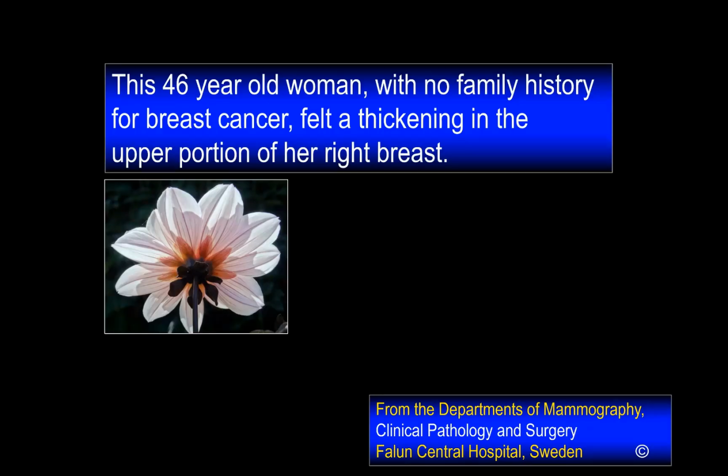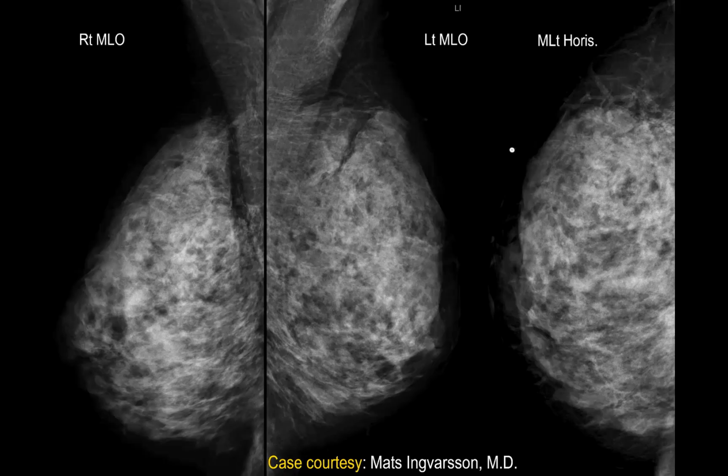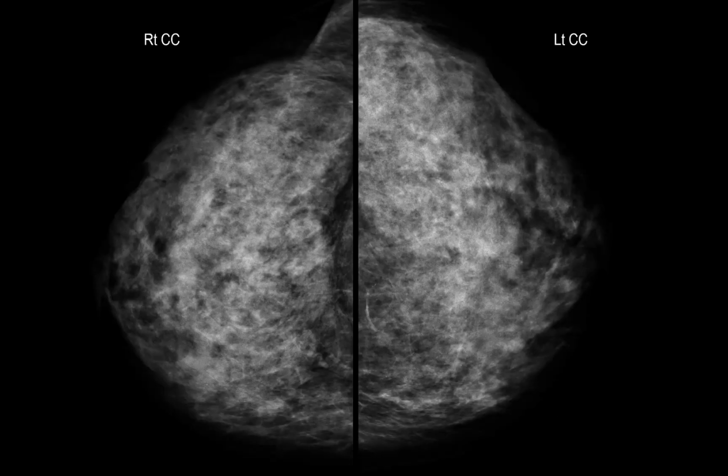No family history, 46-year-old, she felt a thickening. This is a very important term. Do you see here a 10 centimeter carcinoma? 10 centimeter. Do you see or not? Which one, right or left? Of course, you see nothing. And right or left? Nobody knows.